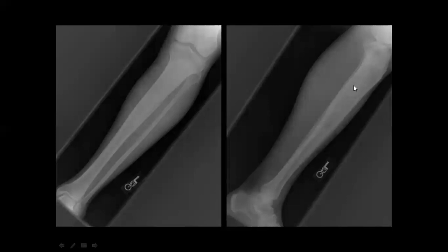So if you would like to say that there is some ground glass, and here, yes, what is your next step? If you say ground glass, okay, sclerosis, increased sclerosis. So this, as we mentioned before, it is a bone lesion, right? Not soft tissue and no joint, because it's away a bit from the joint.